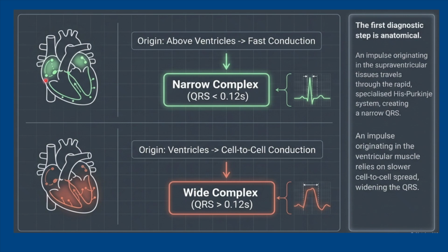In case of supraventricular arrhythmias, when the impulse is generated in the atria or AV node, we expect the abnormality to be in the P wave mainly. But when the impulse reaches the normal ventricular conductive system, we expect the QRS to remain narrow. We call it narrow complex, and we give the tachycardia the term narrow complex tachycardia.